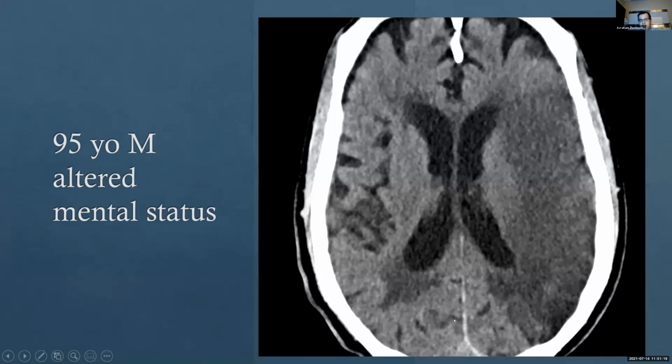This patient has a lot of volume loss because they're older, 95. But if you see here, I'm going to outline it, almost shaped like a wedge or a big pie slice, right? You see it's not as bright as the rest of the brain, and it's very well demarcated. You can make a pencil line through. This patient has already had a stroke, a very large stroke.